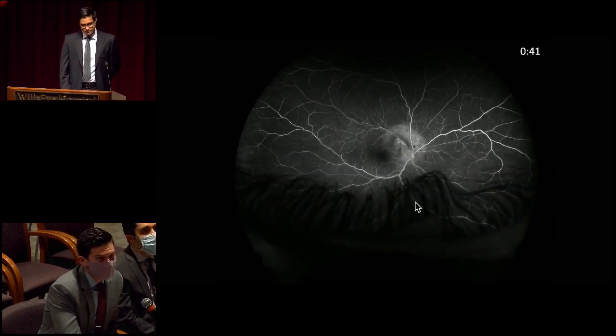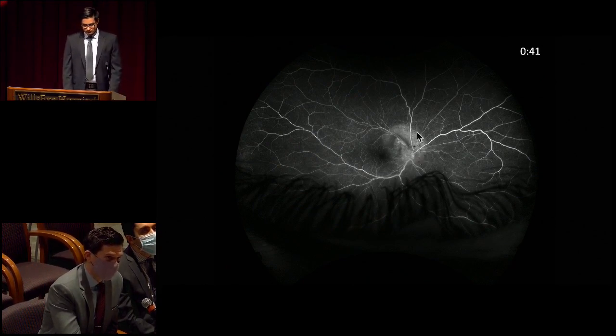We have a later frame. And moving on a little further now in the full AV phase, again, still this area of likely staining versus window defect, as I pointed out before. One could maybe argue there's a little bit of some attenuation in the far periphery here, a little bit of non-perfusion, though it's mild. And I don't see that any of the vasculature itself is showing any prominent leaking. And again, still no macular edema centrally.